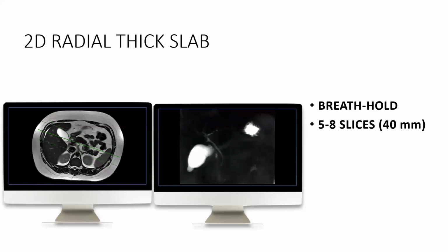The radial thick slab, that is the 2D thick slab images, generally consists of short breath hold sequences of about 2 to 3 seconds. You can acquire one radial slice in that time. These are acquired in about 5 to 8 slices or more, each of about 40 mm thickness, in multiple vertical planes centered on the CBD. So you get rotated images of the CBD and the pancreatic ducts.